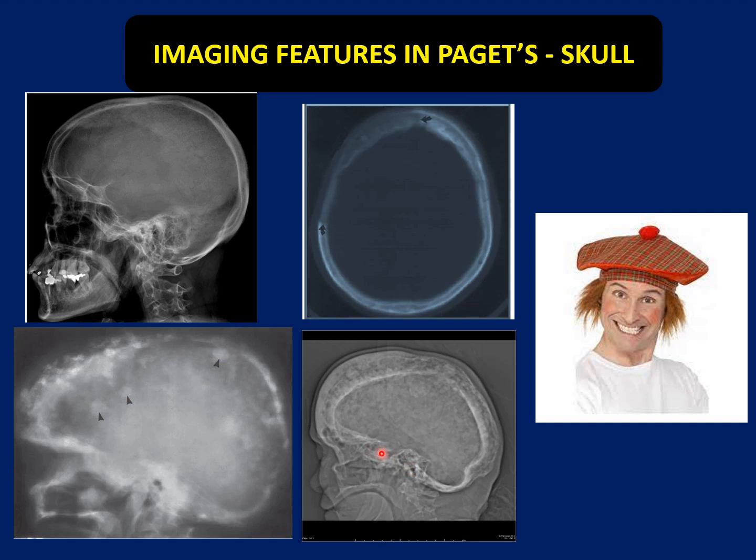Finally, there is the Tam O'Shanter appearance. This is basically a hat with overhanging edges. The cap overhangs and covers the face actually. Same kind of thing appears here. This occurs primarily because of widening of the diploic spaces and platybasia, which leads to flattening of the skull base with the overhanging calvaria when compared to the facial bones. This is the typical hat appearance, the Tam O'Shanter hat.